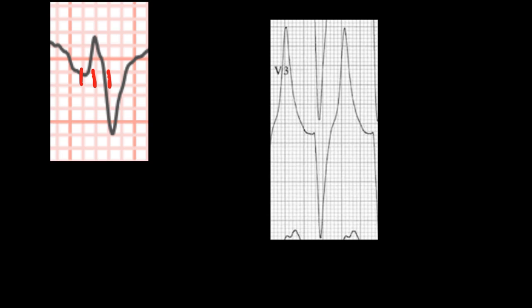Count the boxes. I think my art may have been a little bit off, but for a 41-year-old doing this tech shit, it's really not that bad. You get the point. This one is smack you in the face. No shit, it's wide. Again, insert mom joke. I'm sorry, I went to an all-boys Catholic school and I haven't matured since high school.